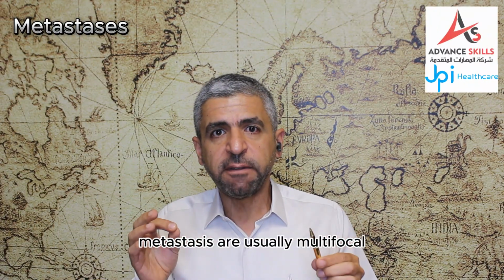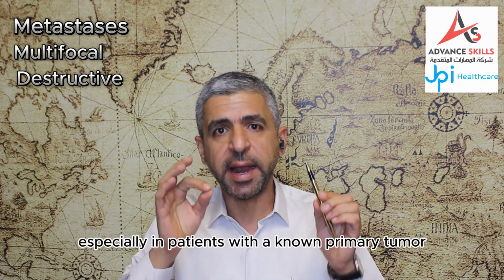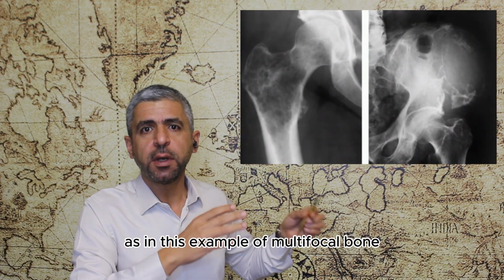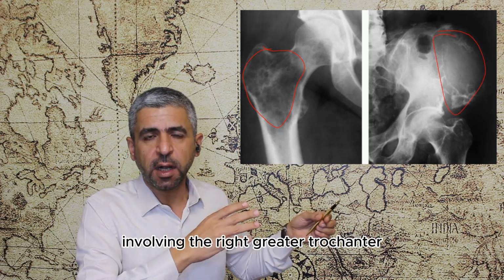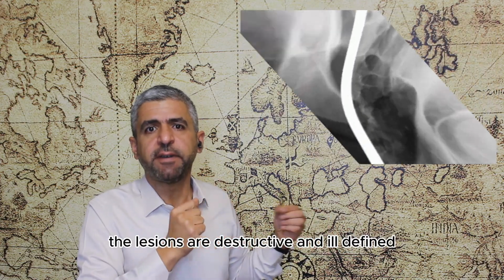Metastases are usually multifocal and destructive lesions, especially in patients with a known primary tumor. As in this example of multifocal bone lytic metastatic lesions involving the right greater trochanter and the left iliac bone. The lesions are destructive and ill-defined.